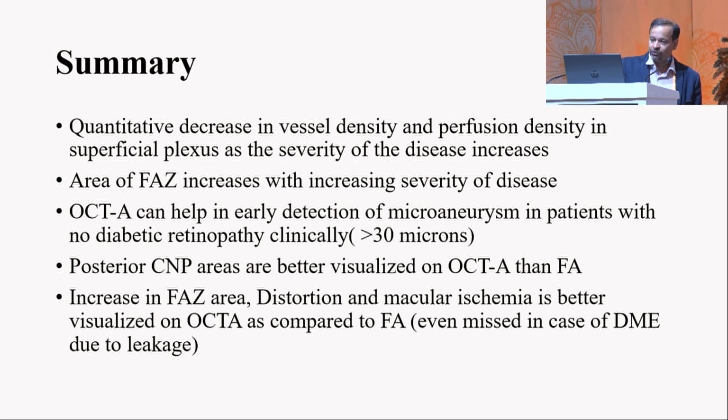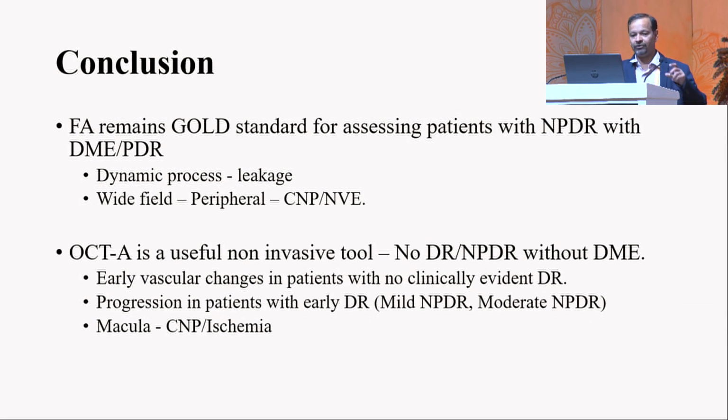And as is known, again, increase in FAZ area, distortion and macular ischemia is better visualized on OCTA as compared to FFA. And remember, when you assess FAZ in these patients, it's always best to assess FAZ in deep capillary plexus and not superficial capillary plexus.